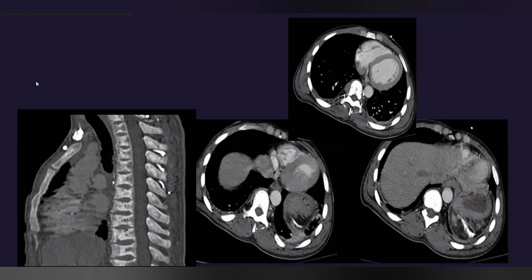So they are fish-shaped vertebra with decreased bone density. Yeah, so you have picked up well on the chest radiograph. So these are just basically fish vertebra, or whatever you call it. Do you see anything in these images?